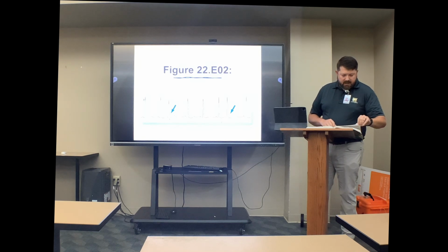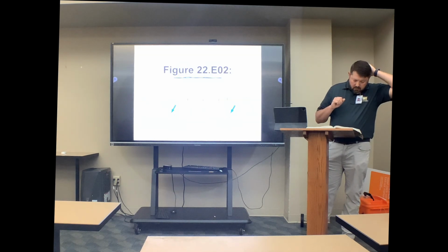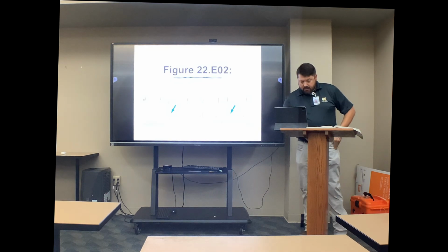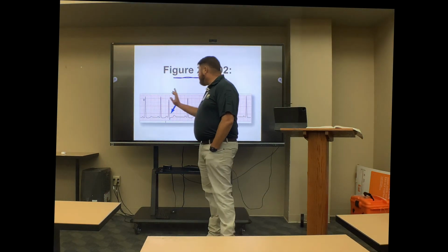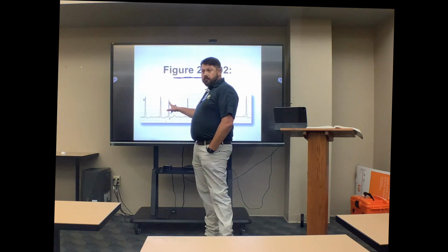This one's a little bit tougher just because of some of the morphology here. Is that the T wave next to it? Well, that's what I was going to say. Yes, that is. I would say that one is kind of hard, but the way I know this is a premature beat is because it's occurring prematurely.